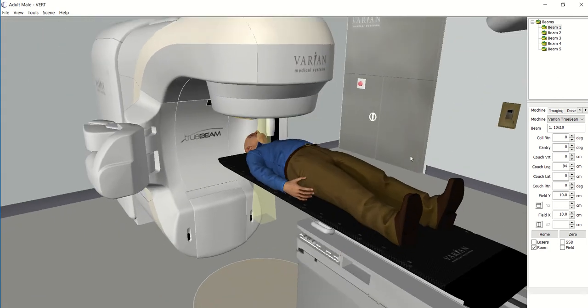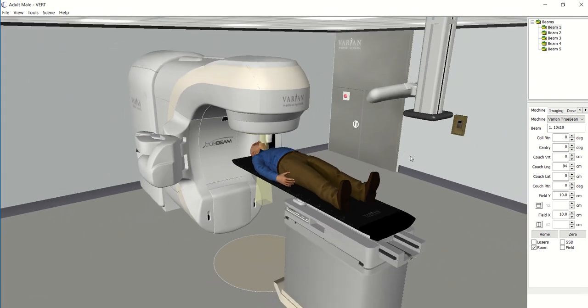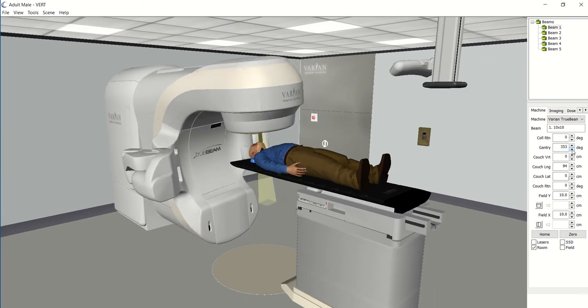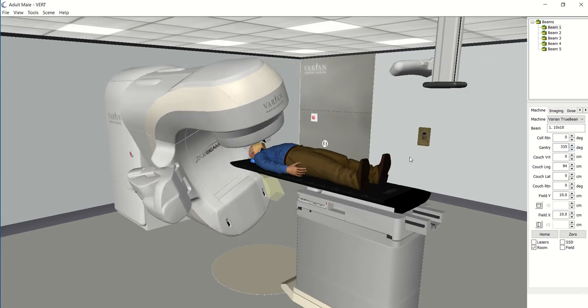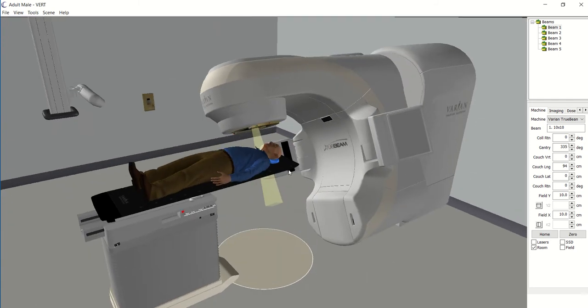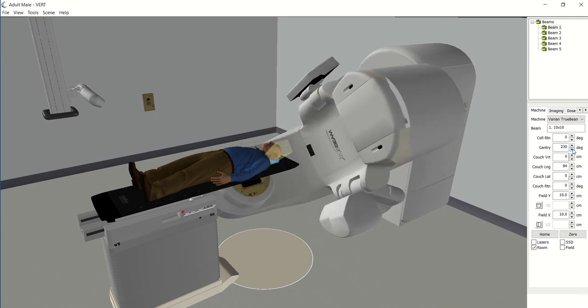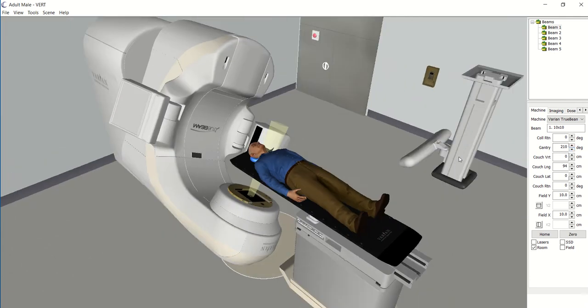So again, when you're out on placement, you'd be setting up these patients into the right position. And then once you leave the room to start the treatment, the machine actually moves around and delivers the treatment from different angles. And does not move that fast.